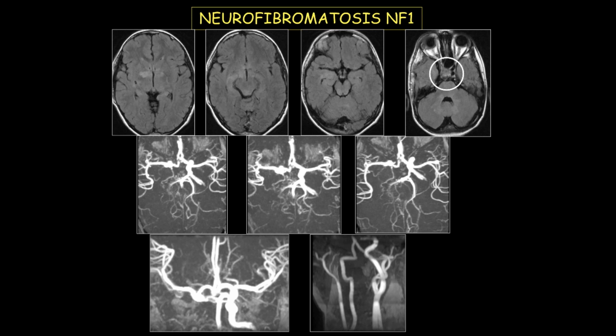to dysplasia. In particular, this was an incredible case, let's have a look here, in which the right internal carotid was dysplastic. We cannot see in this image the internal carotid artery, and also in the reconstruction we can see that this artery is completely absent, is closed, and therefore the circle of Willis, through the vessels from the other side, supplied all the brain.